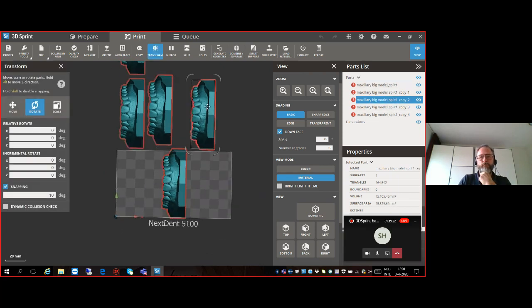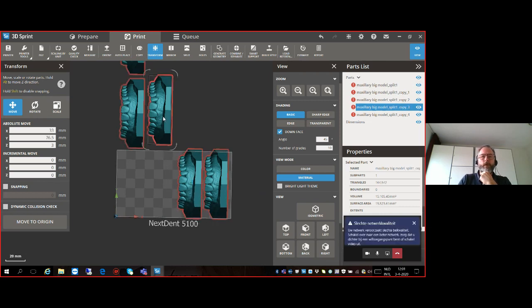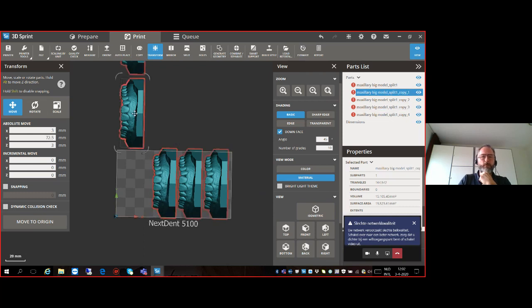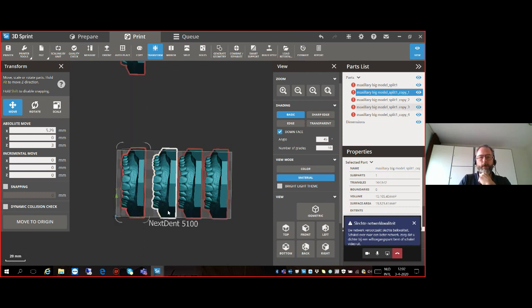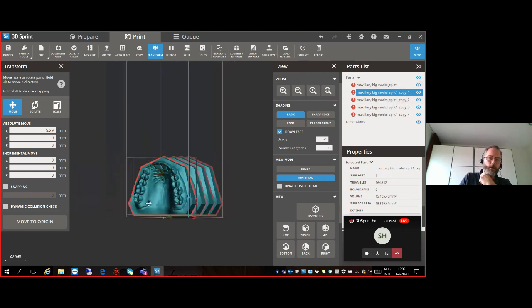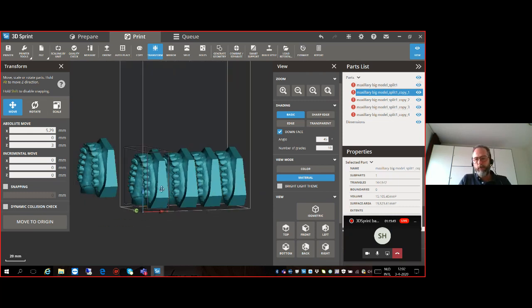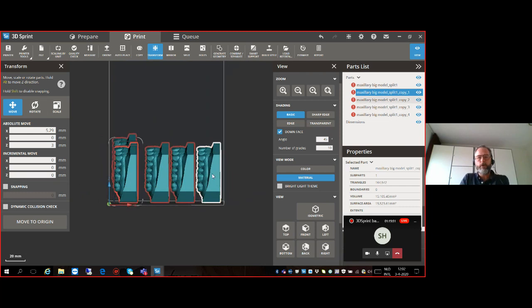Menno, maybe quickly go over what we currently do for orthodontic vertical printing. Yes, so normally for a horseshoe model, now we don't have the horseshoe models because this is a different file at hand, but for horseshoe models at this point, it is perfectly fine to print them in this direction. Now a horseshoe model, of course, we saw this earlier, will not have the big base and it will be without the palate, otherwise it would not be a horseshoe model. But for orthodontic horseshoe models, you can print them like this in the current software.